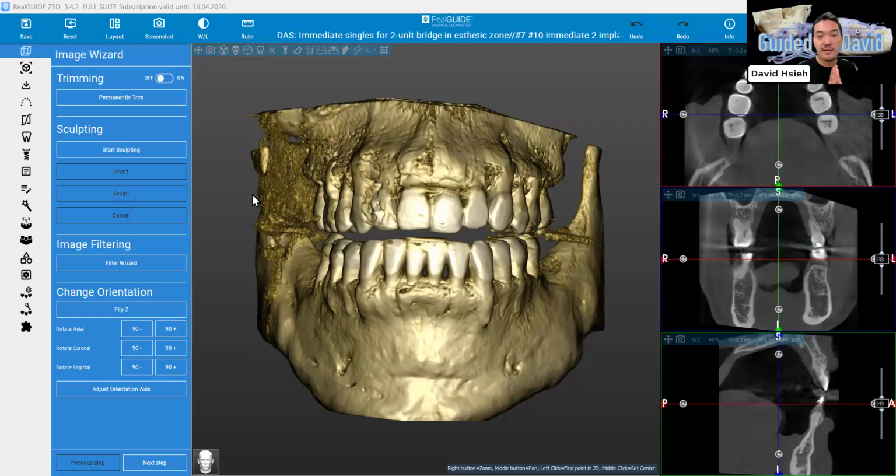So let's get started. Basically you can see the overlay here. If this is the first time you're seeing this, I know what you think. It looks so complicated. I know how it feels, but just stay with me. You'll be fine in the end, right? On the left side here, you can see it's basically the workflow.